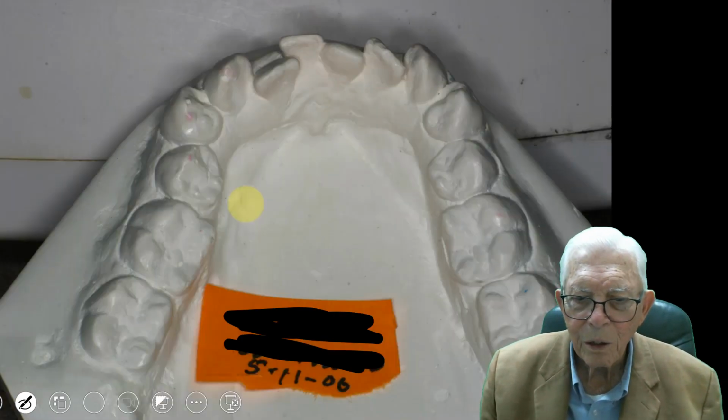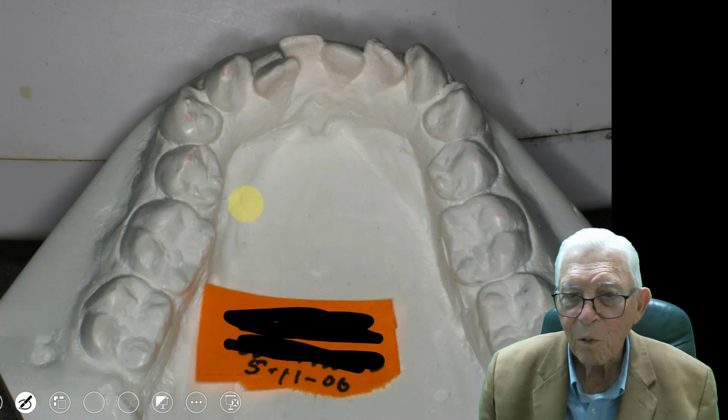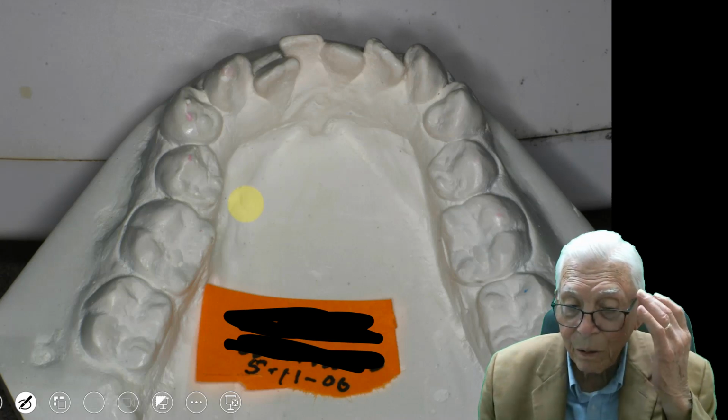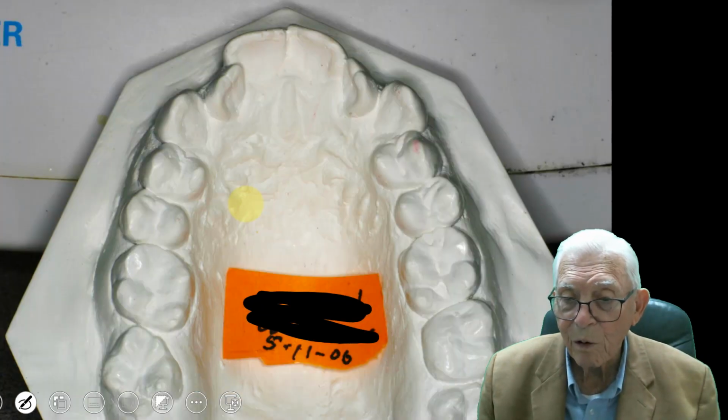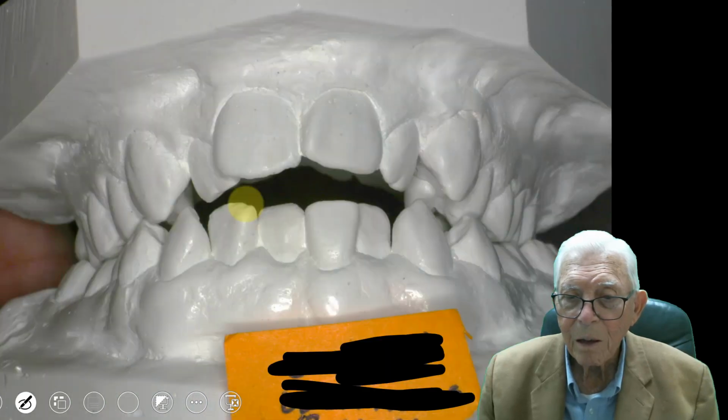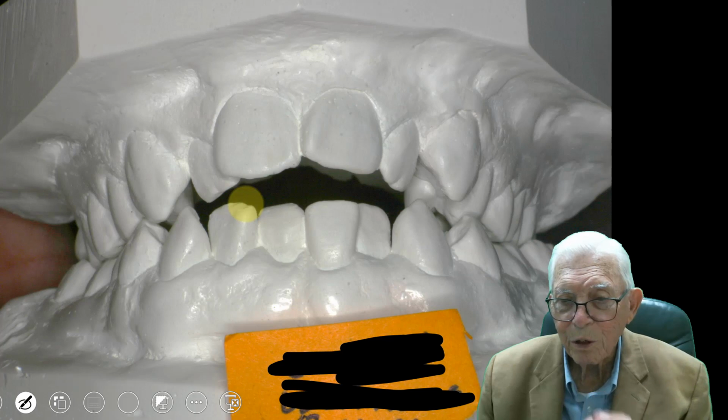And so here the lower was wider, and it's fitting right cusp to cusp, and some spots have got a kind of a cross bite. There's the upper arch, you see, when we started. And the tongue pushes through here.